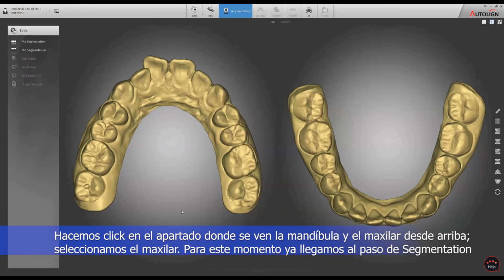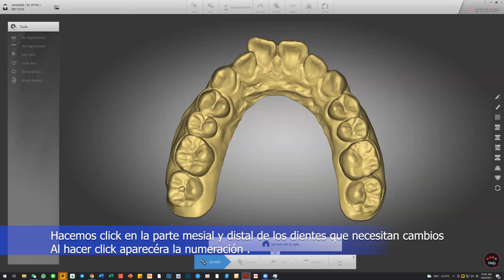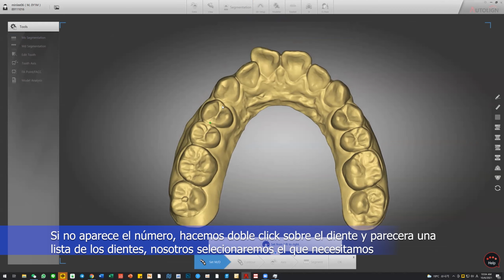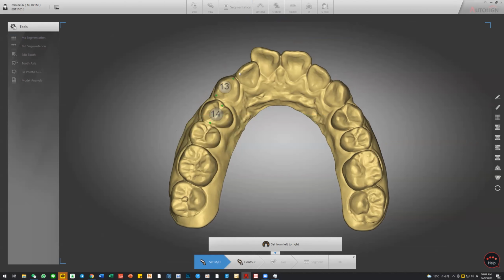The direction is here. We need 2 points, this type measure on each tooth to define the tooth number. And if you click the number sphere, you can change it. In case of missing tooth and wisdom tooth, you can set the numbers of your choice.